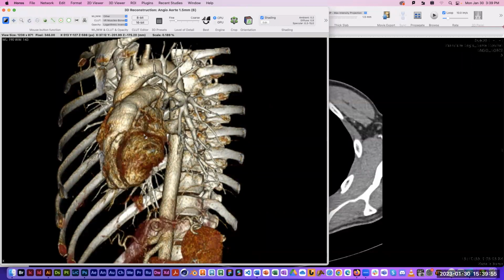So it may be very difficult to get rid of the vessels, which would be kind of nice so that I could actually see the vertebrae and the posterior elements of the ribs without having any of the vasculature in the way. But it doesn't look like I'm going to be able to get rid of that. And I really don't want to reorient this image right now. Because if I start moving it around and rotating, if I try to go back and render the skin of the patient, I'm going to have a hard time getting it back into the same orientation. So once I start exporting JPEGs, I want to try to keep it in the same orientation. In other words, I don't want to rotate around and try to crop off the heart.